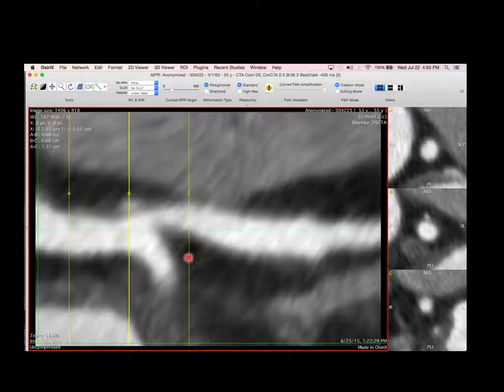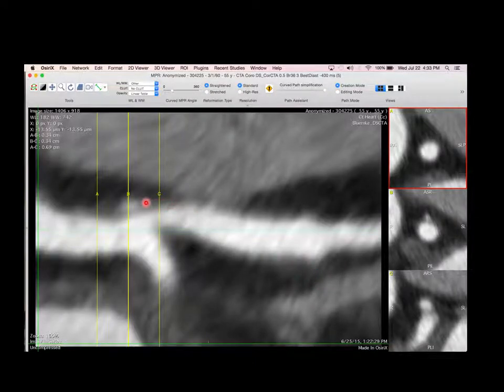So that's the calcium. And then distal to that, distal is away from the source, the vessel opens up to a natural LAD diameter, and here's a cross-section of that. If we push this plane back and we look where this is branching off, you can see it gets pretty darn small compared to this. So this left main descends down to this diameter when it's branching out into the left anterior descending.